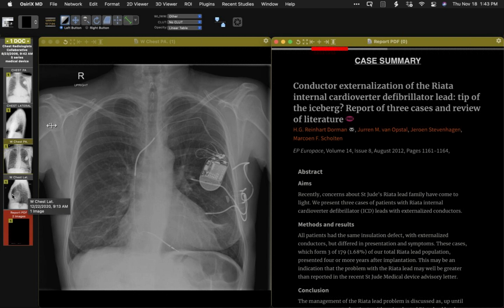I don't know. This particular patient also had a problem with the generator, which was the subject of a recall. Okay. So the cardiologist, I think, knew about this, and they replaced, and that's how I came to see it, replaced subsequently both this lead and the generator as well. But I think the original reports were somewhere in that time period back then. So Howard, I think this is an 06 case.